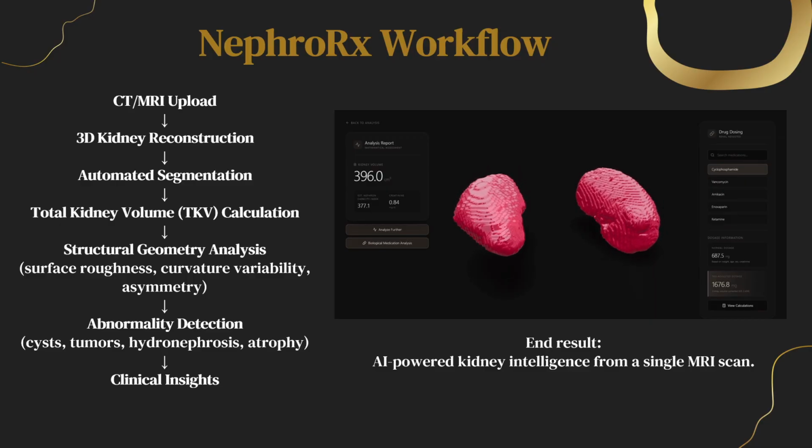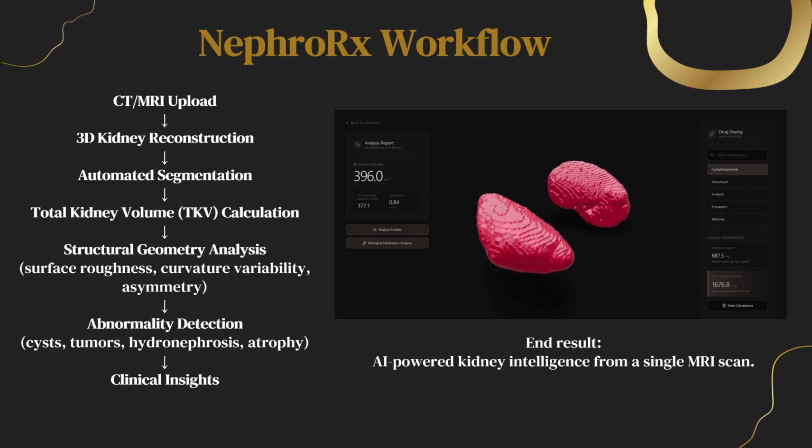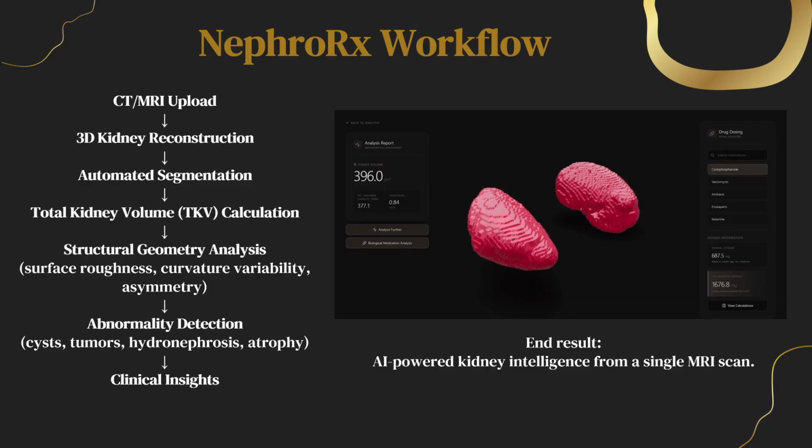We start by uploading a CT or MRI scan. From there, our system constructs the kidneys into a full 3D model and performs automated segmentation. Once we have the mesh, we calculate total kidney volume using vector-based geometry, and then run structural analysis. This helps identify things like roughness, CVI, and kidney symmetry.